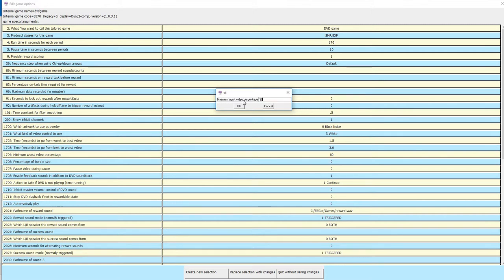This will be different depending on the video that people are watching, and these parameters here, 1700 to 1704, you can edit them within a session. The way that you do that is that you press S for special when you're in the clinician screen. So what we're doing here is we're just setting the defaults so that you may not have to change it every single session.